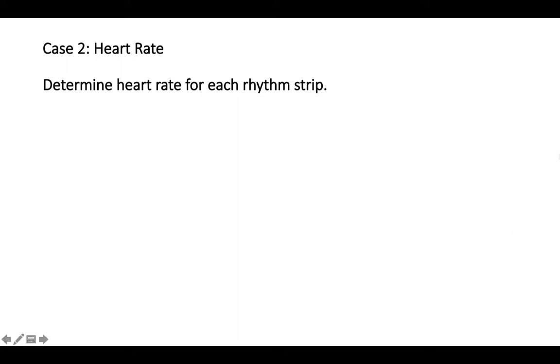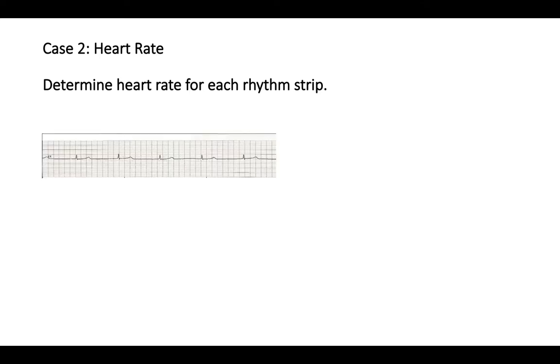Here's case number 2. In case number 2, we will calculate the heart rate. So we'll determine the heart rate for each of the following rhythm strips. First, a word on how to calculate.